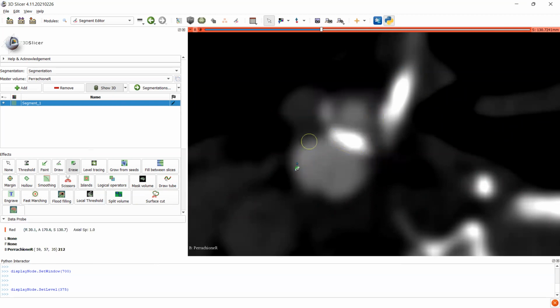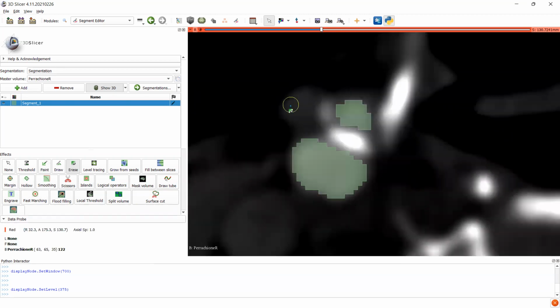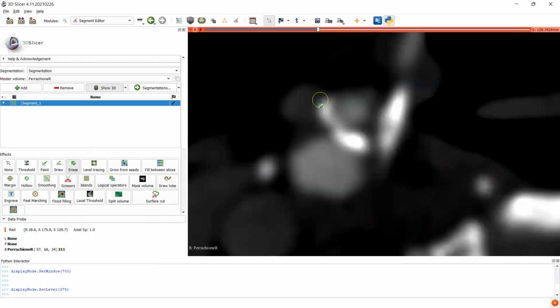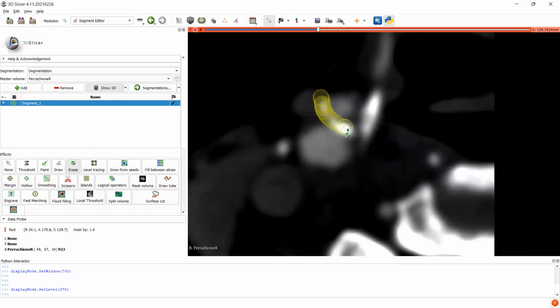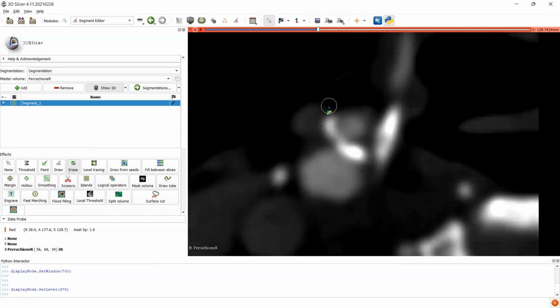You can see there's just some beginning of plaque here. I would guess that's no plaque there. That's good. And again, this area right here looks almost like flow lumen, but it's not flow lumen because you get surrounded by plaque, the bottom right and to the top. That looks fine.